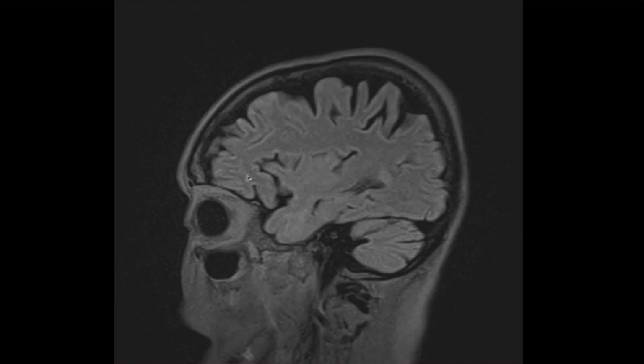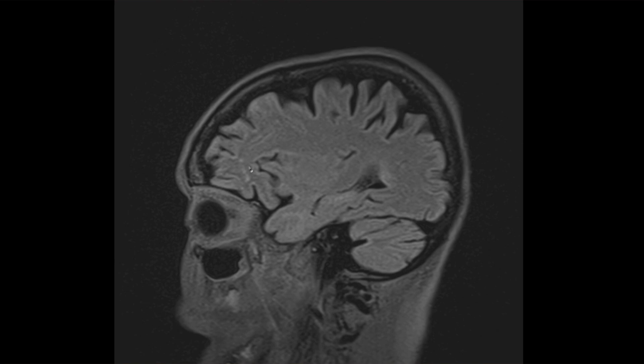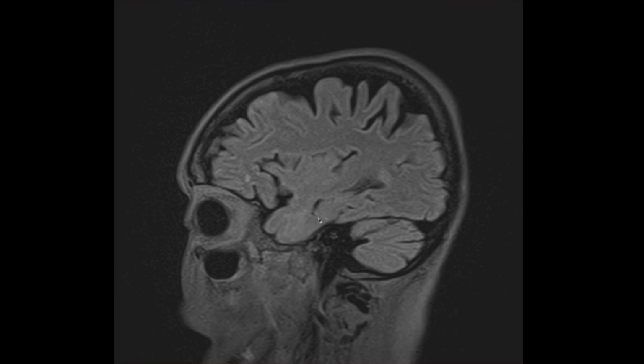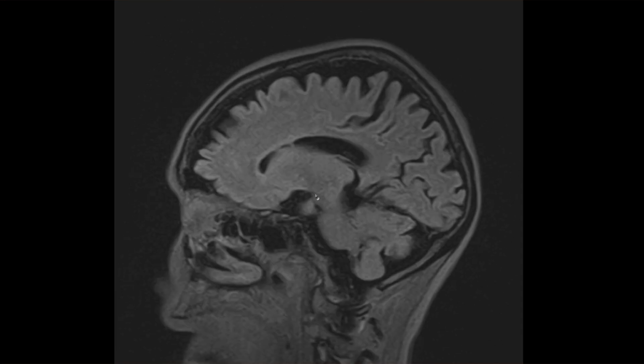Here you can see some of these like frontal FLAIR hyperintensity. So these, it's common to see, especially frontal hyperintensities in patients with migraines or chronic headache. It's pretty much always abnormal to see anterior temporal lobe FLAIR hyperintensities. So kind of be on the lookout for that.